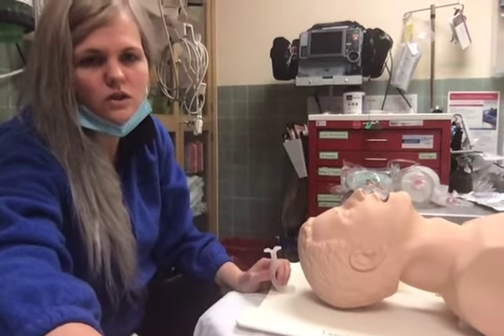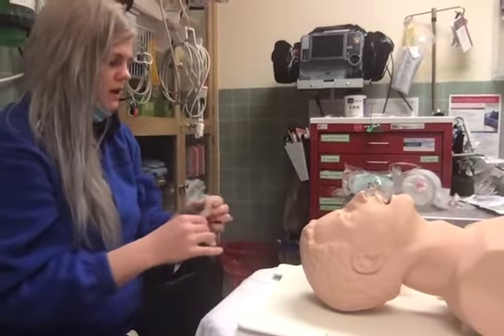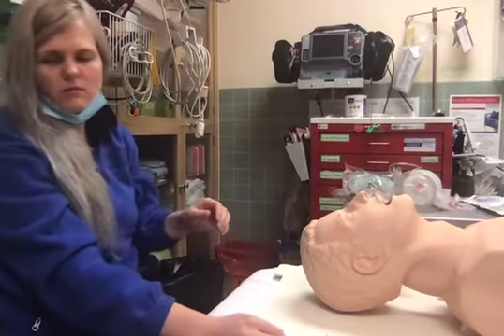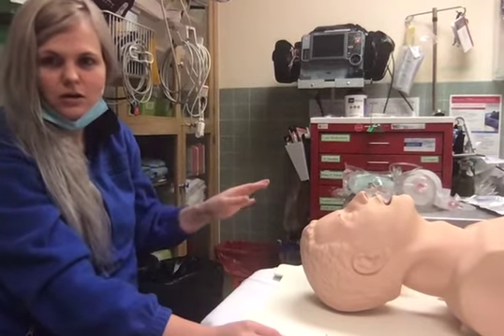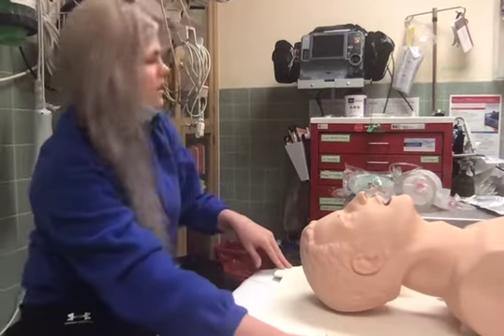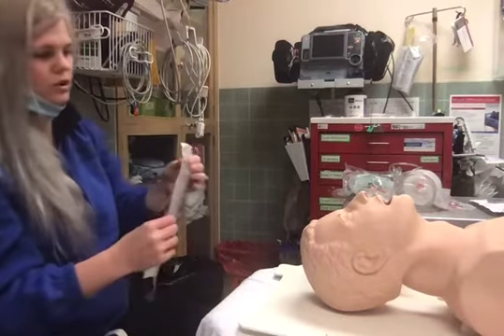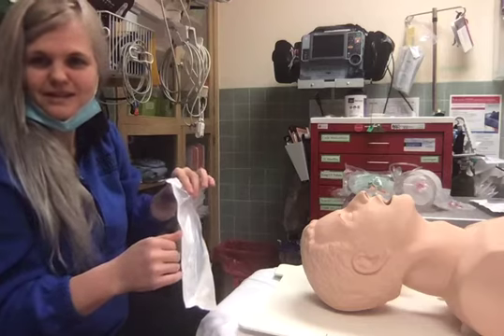On to our next. These adjuncts, of course, are helpful in many different ways. I should make mention, just due to the COVID situation, all airway supplies are incredibly difficult to get a hold of. So the things that I have available, I'm showing you. Otherwise, I will be showing you them in a package. I don't want to take them out of the package and waste them.